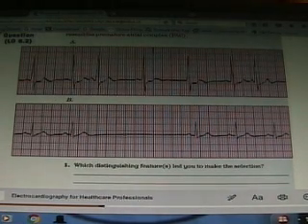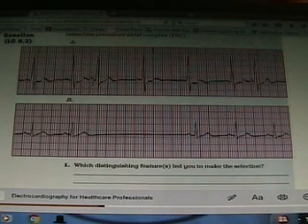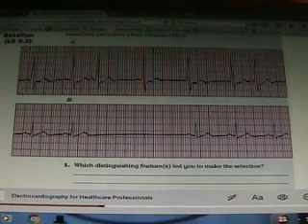Because how do I know? Is there a PQRST on every wave? Yes. Are the R to R waves even? No. So if they're not even, let me look at the P wave of the one that came in too early. Is it a little high? Yeah. Look, it's like 2.5 little boxes. Now, what was this called? Remember last week? This was called what?